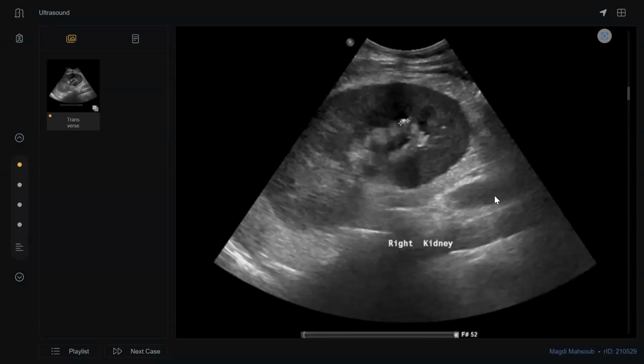This can be a case of bilateral pyelonephritis, and there may be some SOL at the upper pole of the right kidney that can be a developing abscess. That can be one possibility. For confirmation of my finding, I will check the lab parameters, the previous imaging and a detailed history of the patient, and go for a CT scan of the patient if KFT are normal.